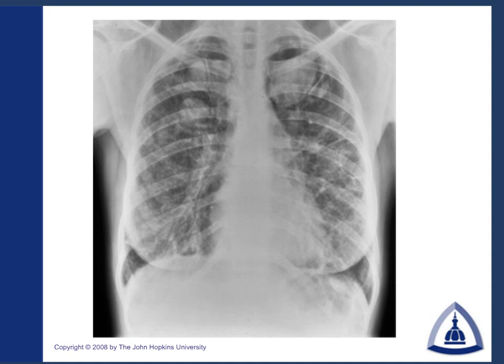And the key here is that you see this ring around it. This is called a crescent sign. In a patient with fibrocystic sarcoid, these are aspergillomas, okay? And in sarcoid, fibrocystic sarcoid, and old tuberculosis with some cavitation, these are fairly common, okay? The key to remember is the crescent sign and this mass or nodule inside the old cavity. Aspergilloma.